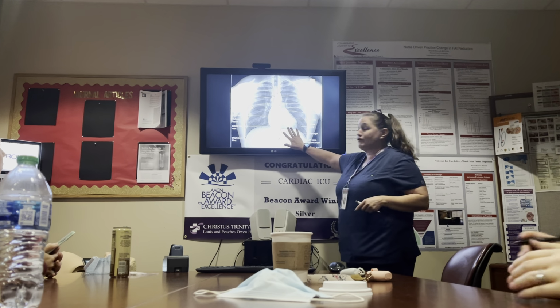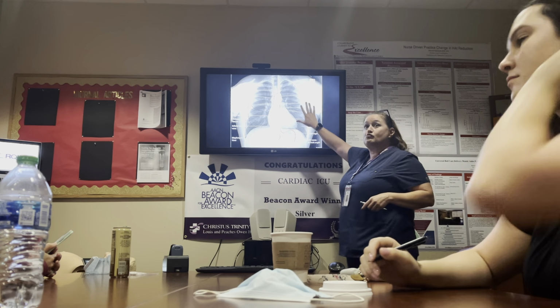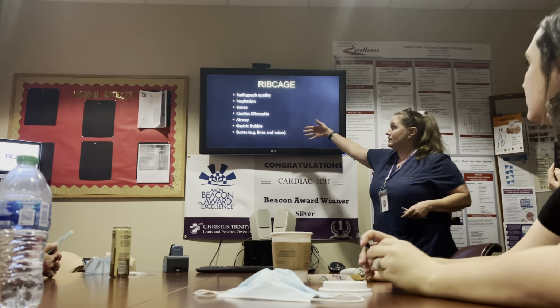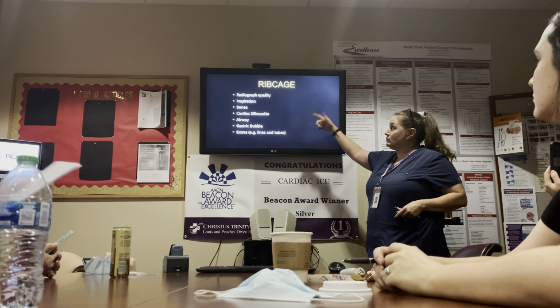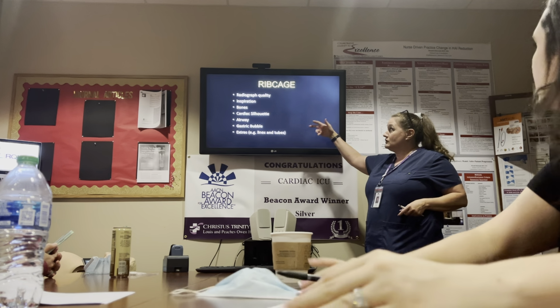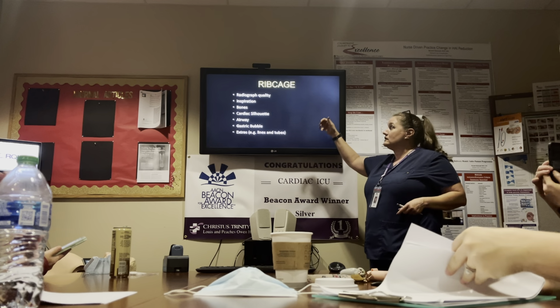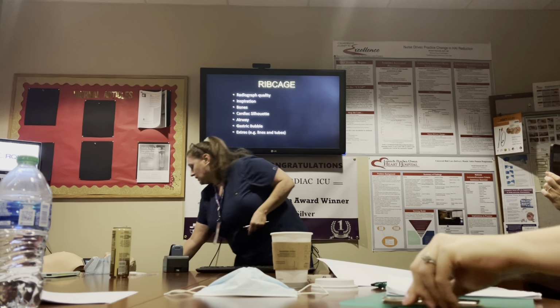We're gonna go through each piece of the x-ray in a mnemonic. So here's an overlay of what all can be found in the chest x-ray, as far as normal anatomy goes. As we're going through, my mnemonic to remember and be able to read a chest x-ray is called RIB CAGE. So we want to look at the radiograph quality, the inspiration, the bones, the cardiac silhouette, the airway, which includes the lungs, the gastric bubble, and any extras that might be in the chest x-ray, okay?